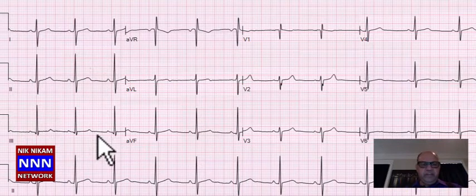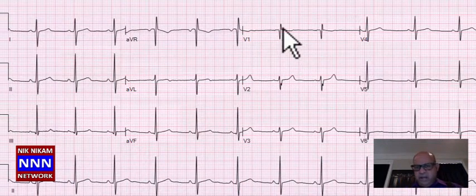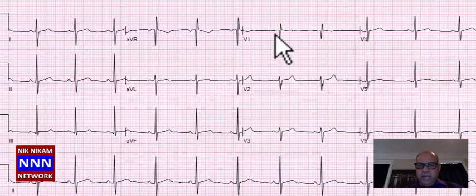Okay, we got a sinus rhythm here. High anterior looks okay. Inferior leads look all right. Anterior leads look all right. Non-specific T wave changes. Again, we have an RSR prime here, but more importantly, non-specific STT changes.